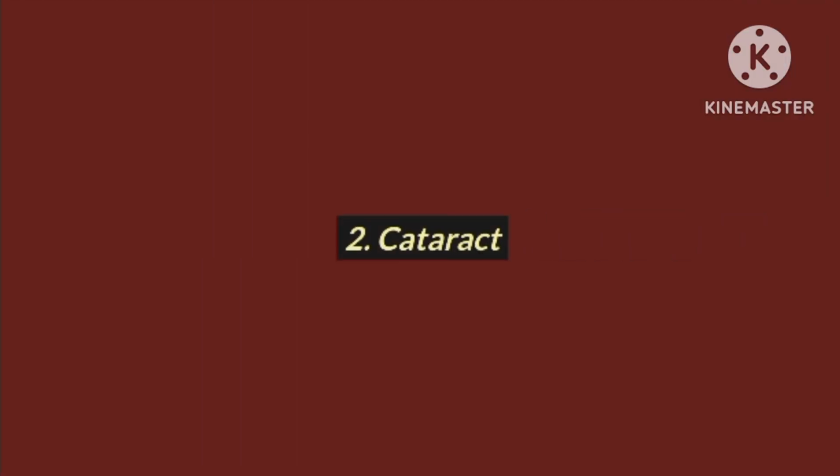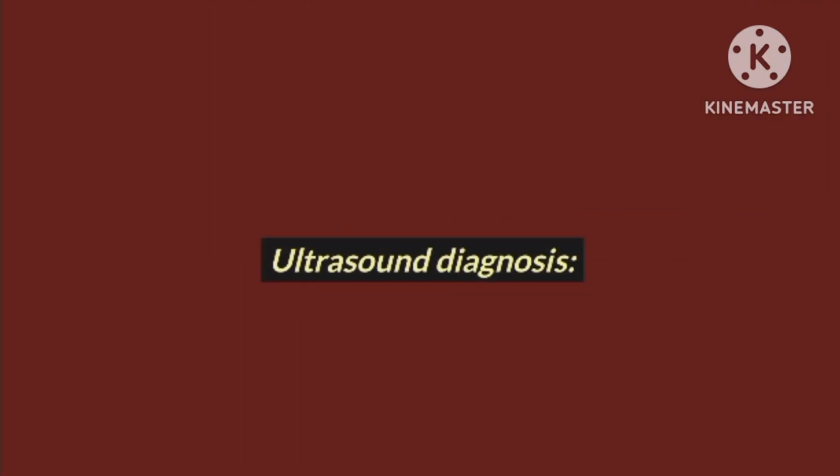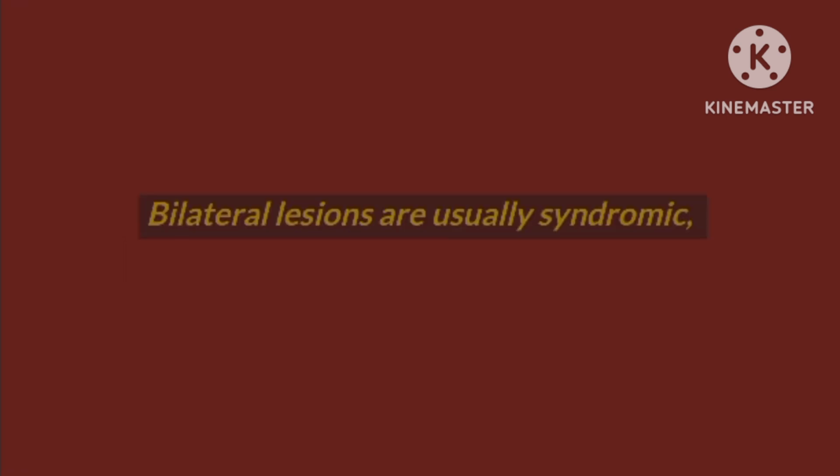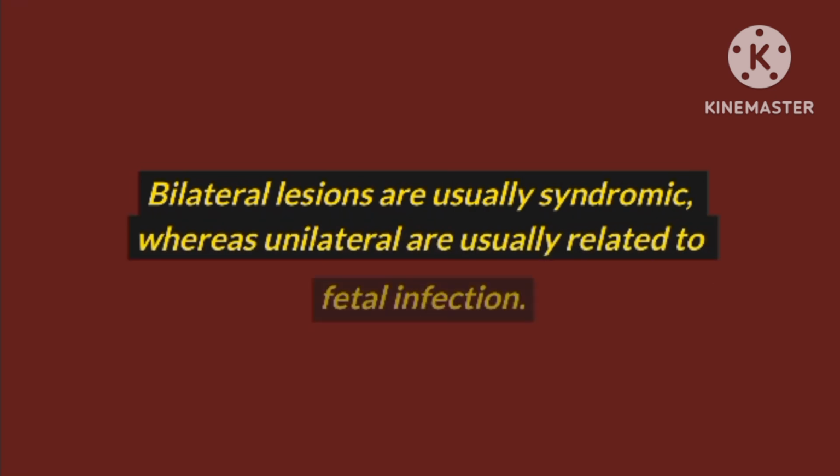Number 2, cataract. Ultrasound diagnosis: unilateral or bilateral opacity of the lens. Bilateral lesions are usually syndromic, whereas unilateral are usually related to fetal infection.